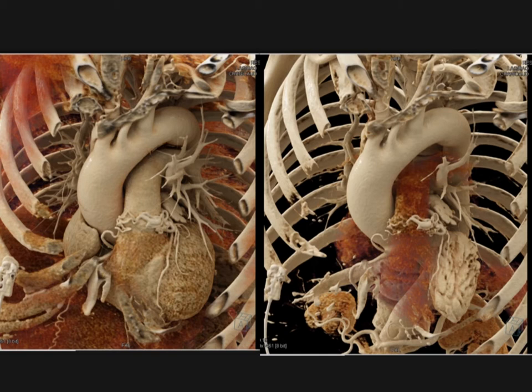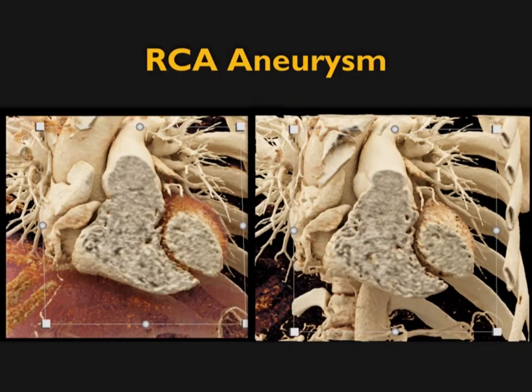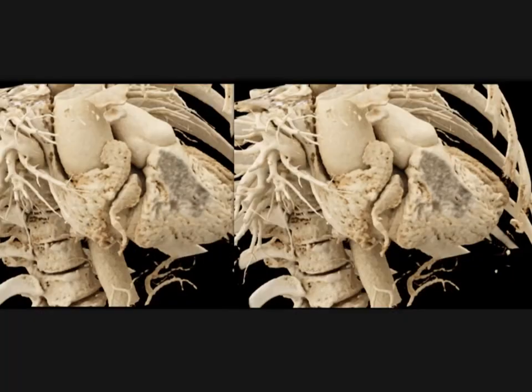You can also tell that the coronary artery fistula arises off both the right and left coronary arteries. In this case, the patient has a right coronary artery aneurysm. It's atherosclerotic in nature. It's not Kawasaki's. It's not anything else. It's not polyarteritis nodosa. I'm cutting through the heart. I'm rotating. Now look down the AV groove. You can see the right atrium. You can see the coronary artery sitting there.